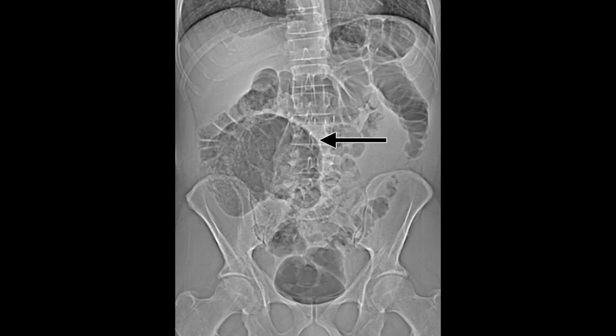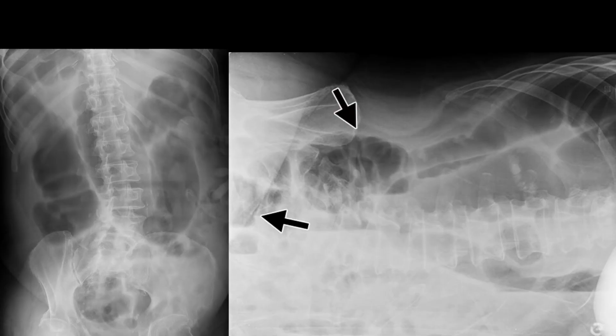Again, we can see a dilated cecum here. Now this is a case in which the patient was paralyzed because of pontine hemorrhage, and we could see that there was distension in the abdomen. If you see the x-ray here, AP view is given, and a right lateral decubitus x-ray is shown here. In both images we can see grossly dilated bowel loops. So this is also a case in which there is no active obstruction, but because the patient is paralyzed, the bowel loops are dilated because of no active motility, more like an ileus condition.